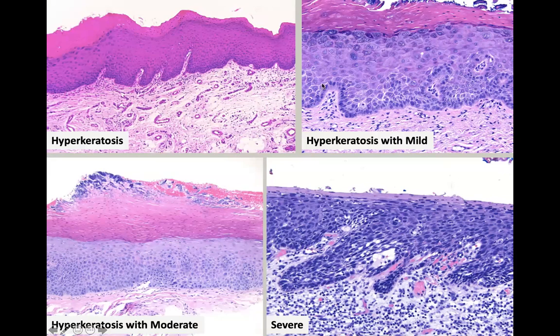So in the epithelial layers, we want to look for nuclear enlargement, hyperchromasia, mitotic figures, loss of polarity or disorganization of this basal layer, as seen here in mild dysplasia. When we grade the dysplasia of the oral cavity, we eliminate the superficial keratotic layer. So when I'm grading, for example, I'm only grading from here to here. And as you can see, the basal layer is quite expanded to occupy about 2/3 of this epithelium. So this we might call moderate dysplasia.